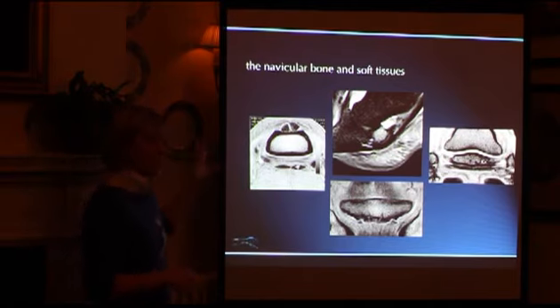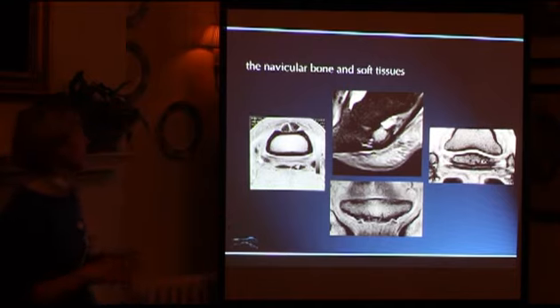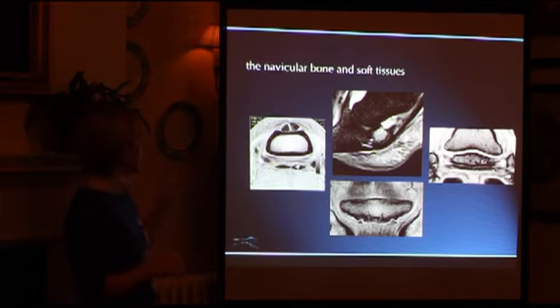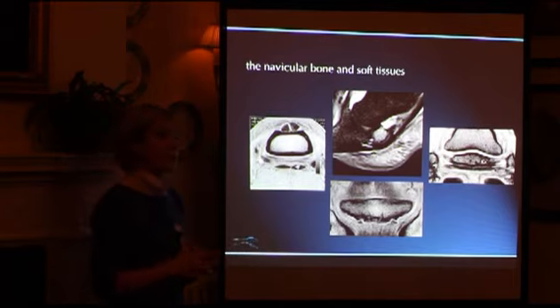So this is an excellent way of finding that type of lesion, and there are a whole raft of different morphologies of that particular injury, as I'll show you later. But the system is excellent at finding those types of lesions, which are real. It really does change how you're going to manage that case once you know it's carrying a lesion like that.